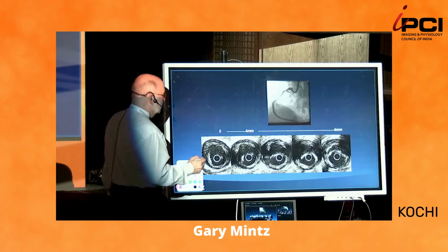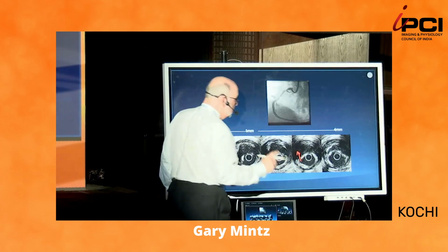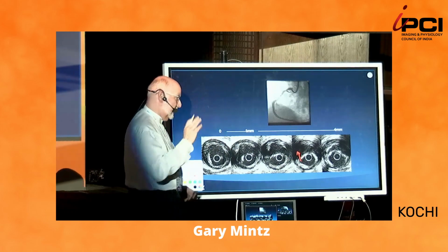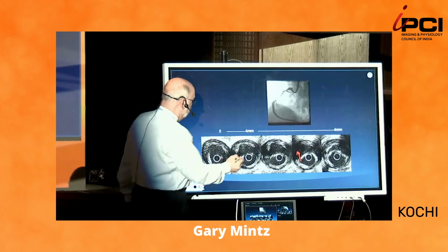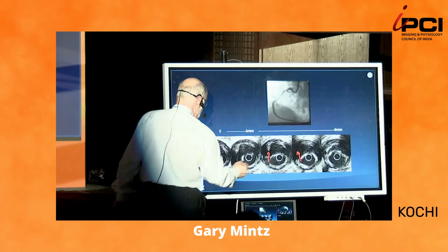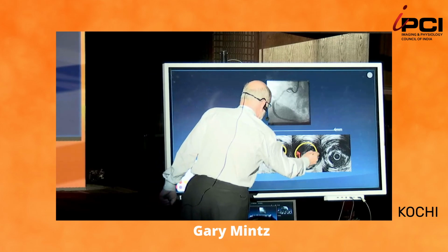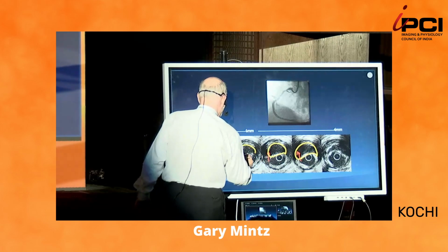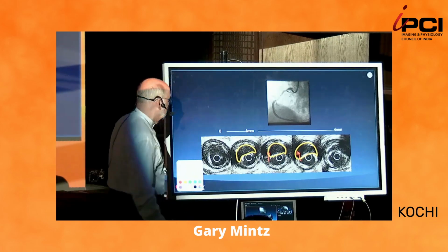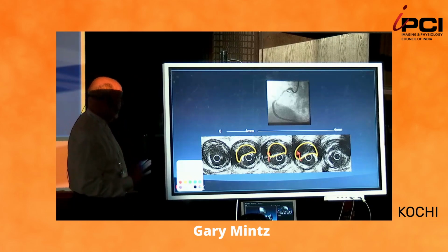So plaque rupture is a break in the fibrous cap, usually at the lateral attachment, can be central, but usually it's lateral attachment here and here, with a cavity. Cavity, okay? Very simple. You can't tell how old it is. We can only tell if it's anatomically present.